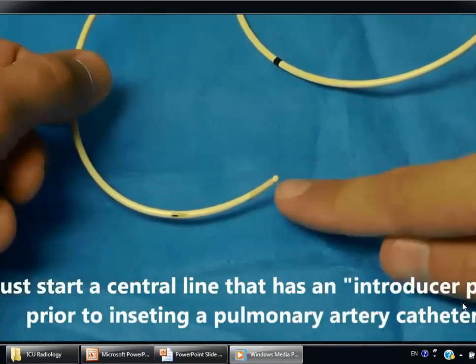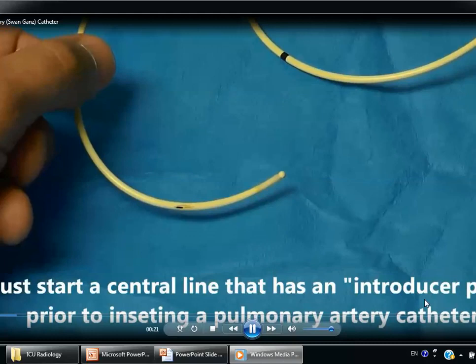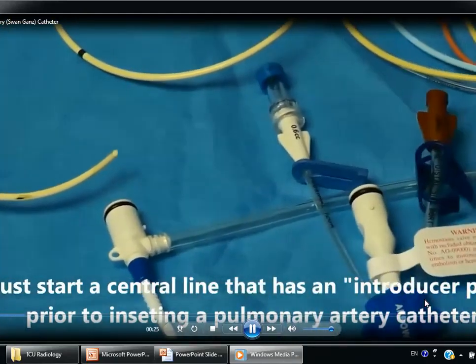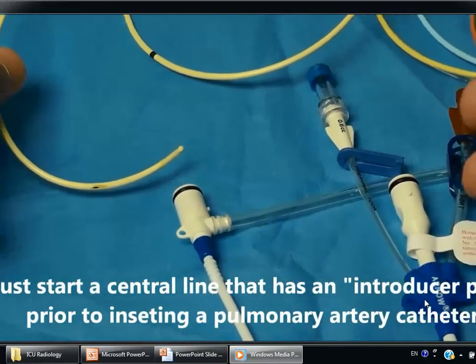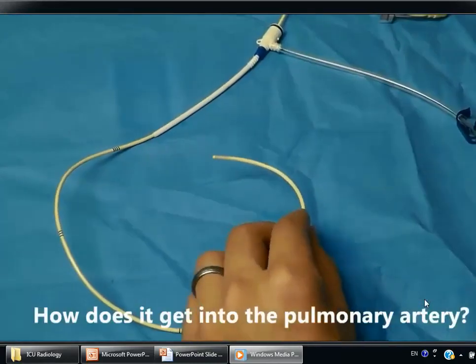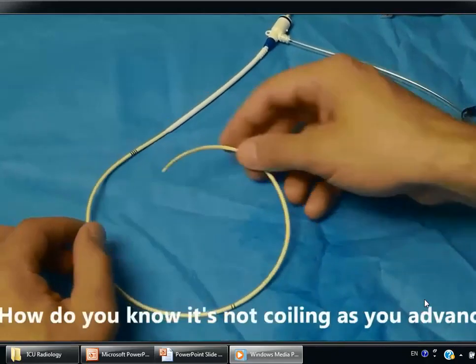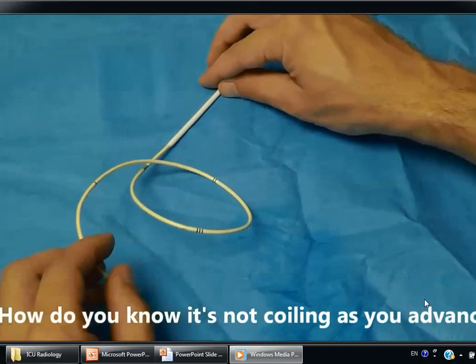In order to get this into a pulmonary artery, you have to start a central line with a central catheter that has an introducer port, and then you're going to insert the Swan through the introducer port and guide it into the pulmonary artery. So the first question you're probably going to have is how does this actually get into the pulmonary artery, and what prevents this from coiling up like this in someone's atria or ventricle?